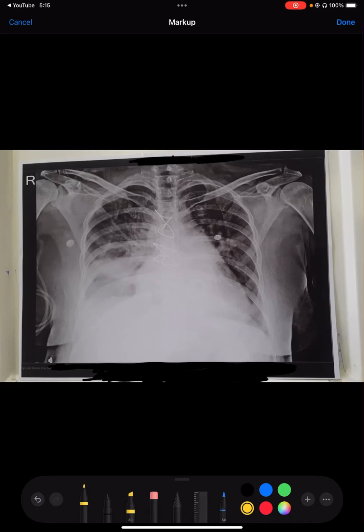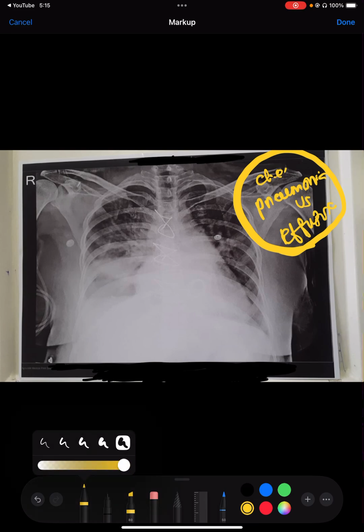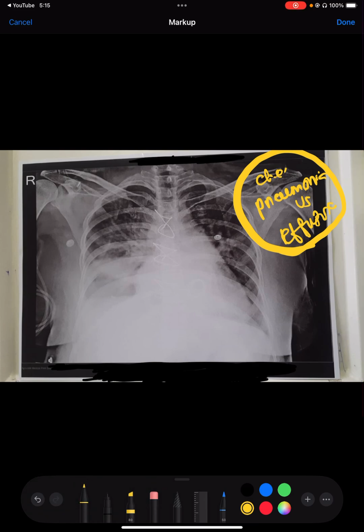Now today we'll be discussing the main chest X-ray differentiation, that is pneumonia versus pleural effusion. The thing that is definitely clear is that most of the time effusion can be because of underlying pneumonia, or it can be simply pleural effusion. So if the patient has effusion, the patient may definitely have underlying pneumonia or underlying consolidation or an underlying lower respiratory tract patch, and that can be very commonly associated with effusion.